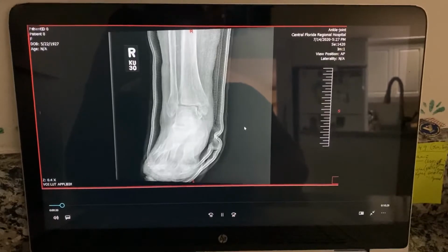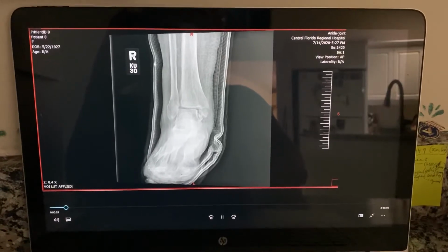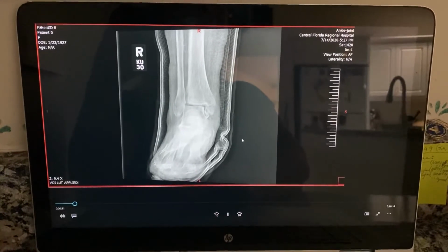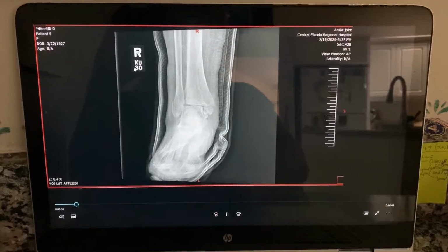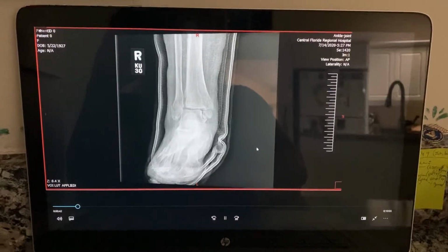No removable artifacts are seen on the image. However, an overlying cast is present, reducing detail of soft tissue and bony detail. The right marker is present, and the patient's PII has been removed. The part, tube, and IR are all aligned.